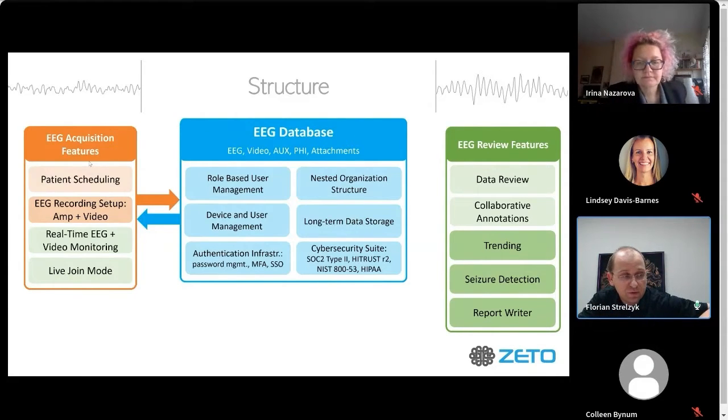You can have multiple tenants, multiple users at the same time interact with the same EEG data set without getting in each other's way. You can use your own horizontal and vertical resolution and those types of things. And I'll just show you so it becomes a little bit more illustrative.